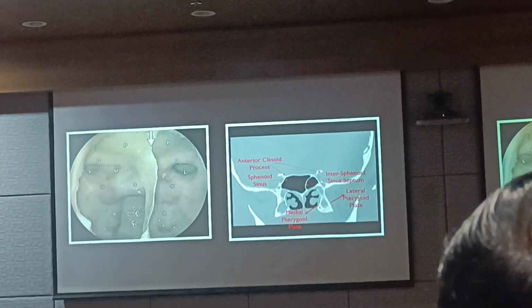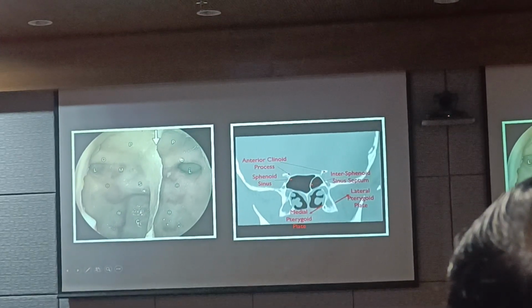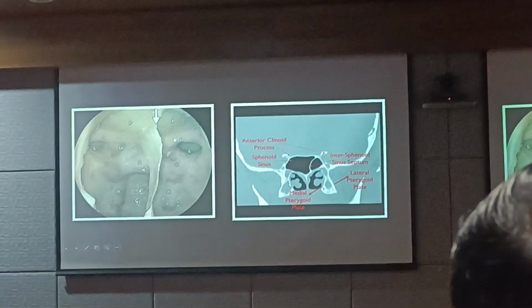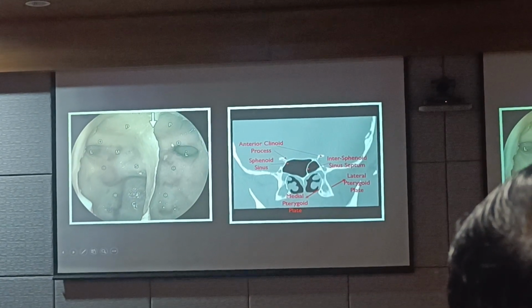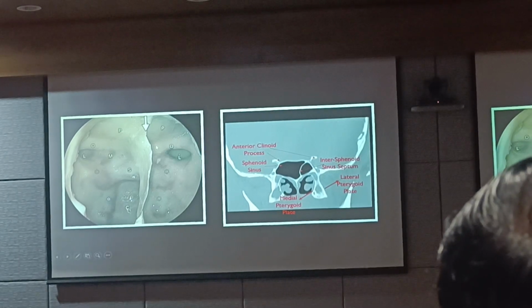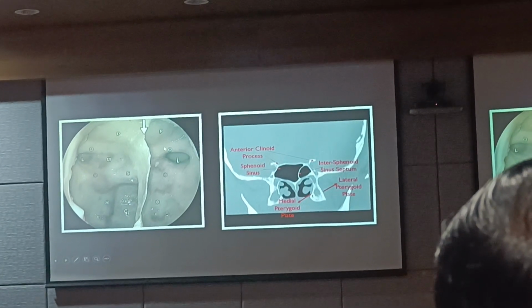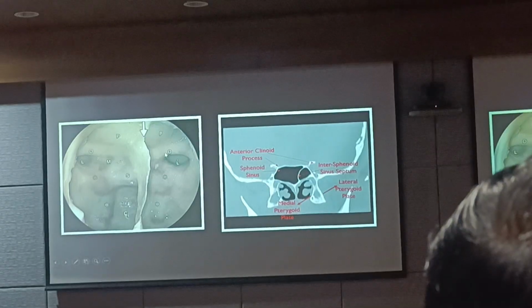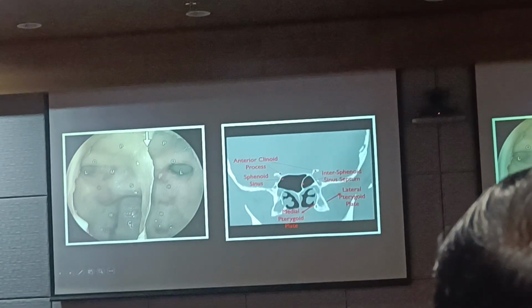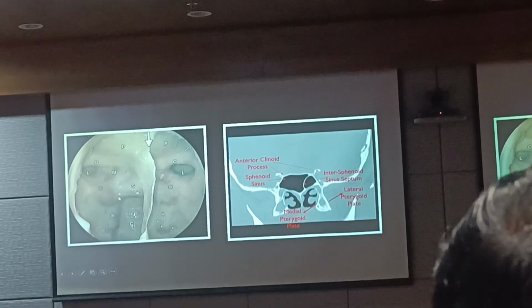Optic nerve? Yeah, this is the optic nerve over here. So if you follow the orbital apex, you see this optic nerve coming over here. Till here, it's all extracranial. Once you see this thing disappearing here, it is intracranial, within the CSF. So even to do optic nerve decompression, you can decompress only till here. Beyond this, if you do, you're going to get CSF leaks. Everyone clear about this? So this is how all this translates.